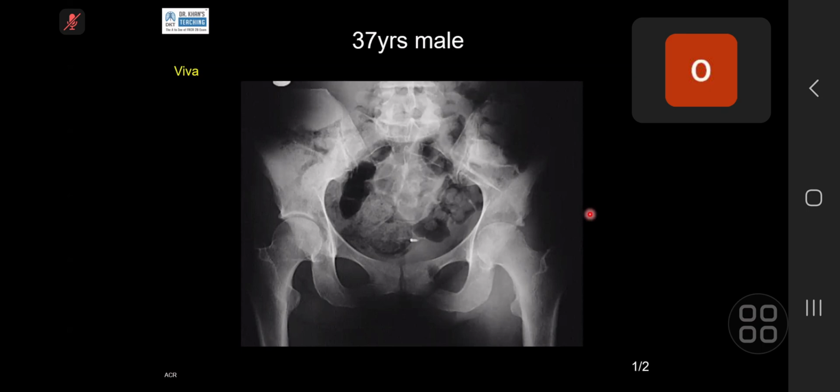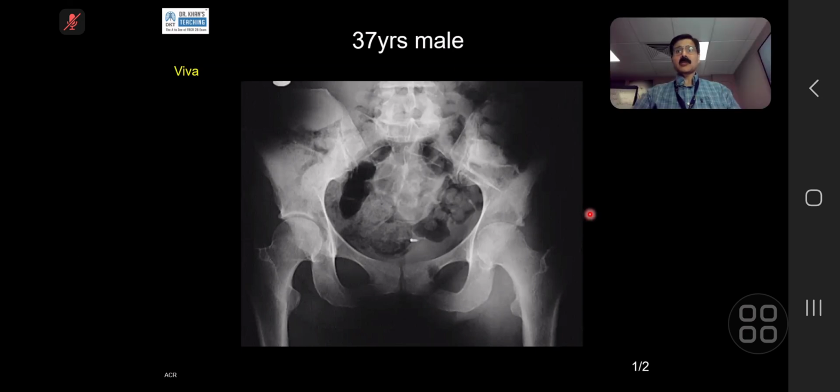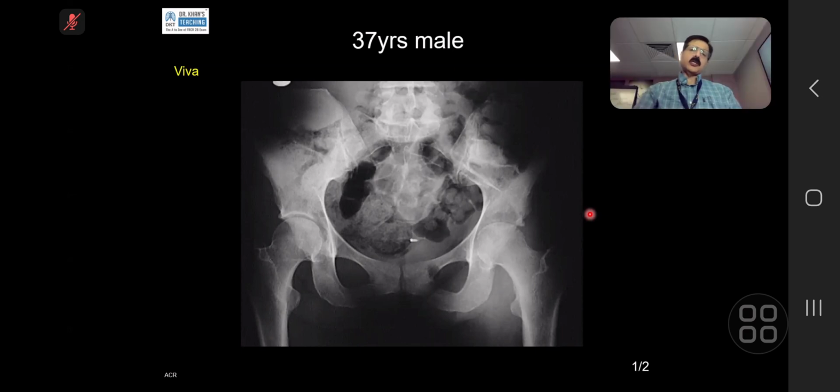So my first differential diagnosis would be septic arthritis. I would do ultrasound to confirm my findings. In an adult, you can do ultrasound, but what is better? So do MRI? Yeah. In children, the point is that you do ultrasound, confirm it and aggressively treat it. This is quite a full-blown case.